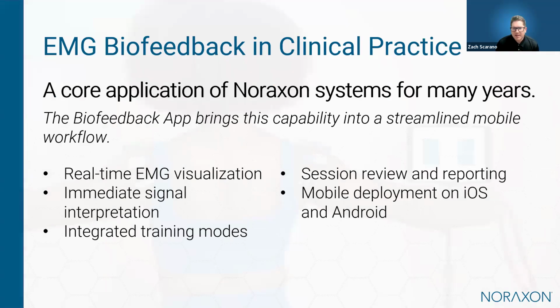And so that leads us to the next point. So EMG biofeedback itself is not new. In fact, this has been a core application of Noraxon EMG systems for many years, since the inception of our company. But what the biofeedback app does is it brings those capabilities into a simplified mobile environment.